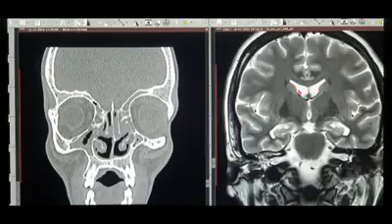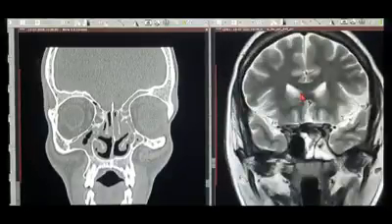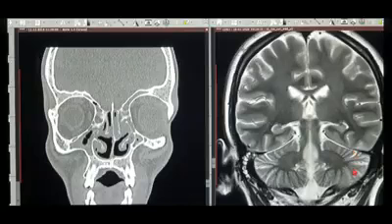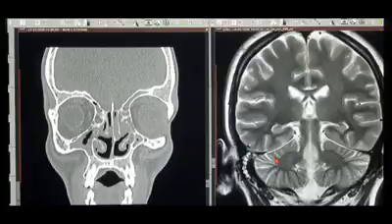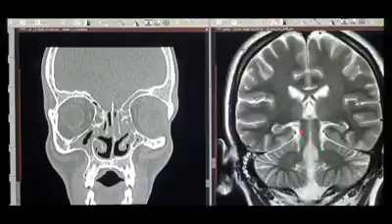So you can see the ventricles full of CSF, and as you keep on going further behind, you can actually see the area of the cerebellum. Not just the soft tissue, you can actually see the tentorium cerebelli, the tree-shaped appearance of the cut surface of the cerebellum. So you can actually appreciate the entire structure of the brain in detail.